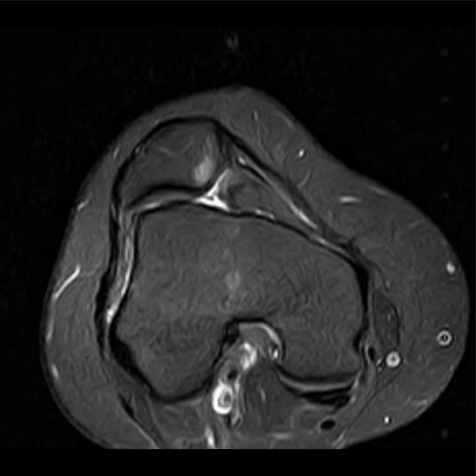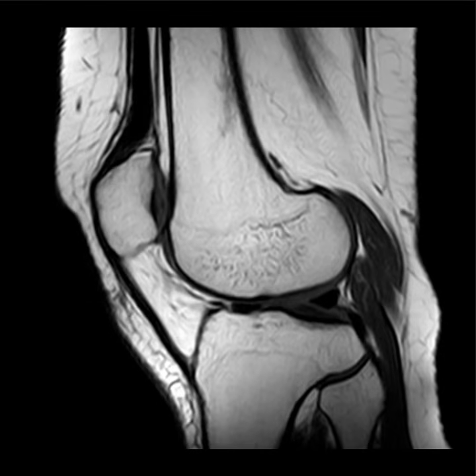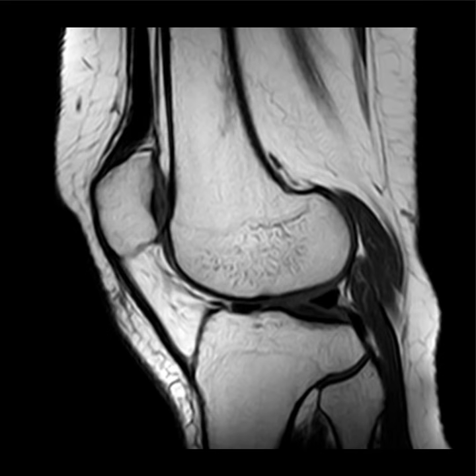Well, sir, I can't think of anything. If you can help me, please. Patellar dislocation, especially if it is recurrent, is usually associated with patella alta. And where do you see patella alta? Of course, on sagittal images. Good job. So let's go and see sagittal images. These are the T1 weighted non-fat saturated sagittal images of the knee, and I think here we can clearly see that there is patella alta.